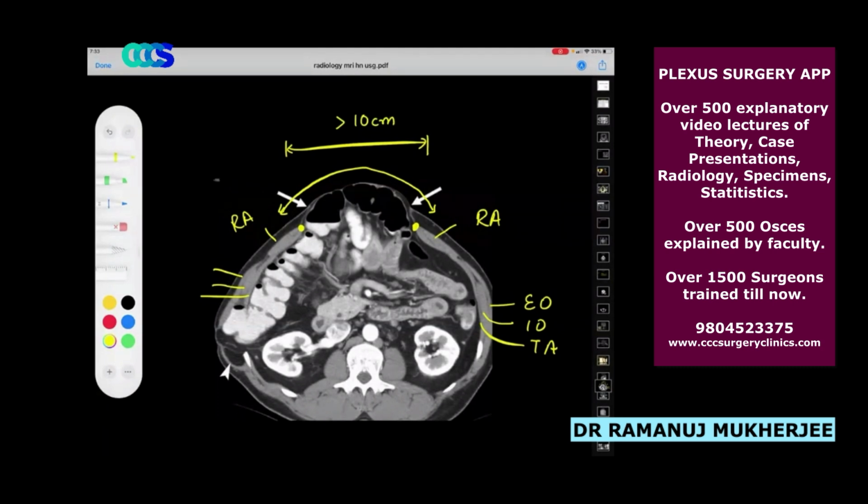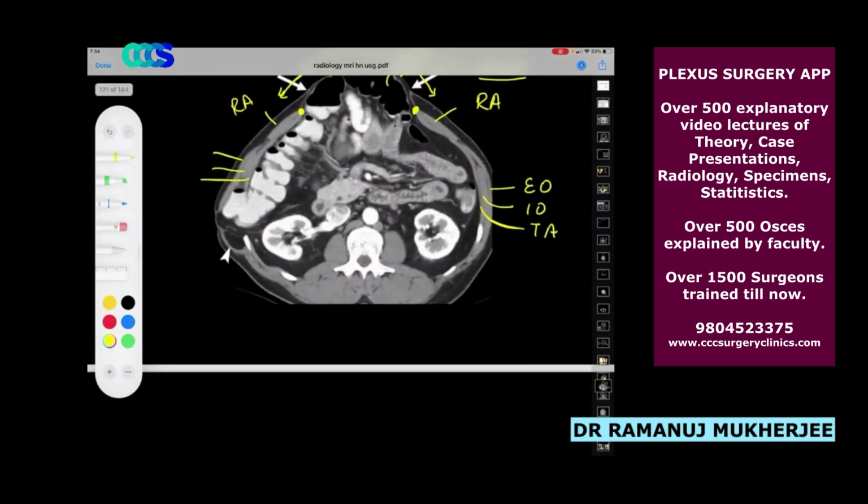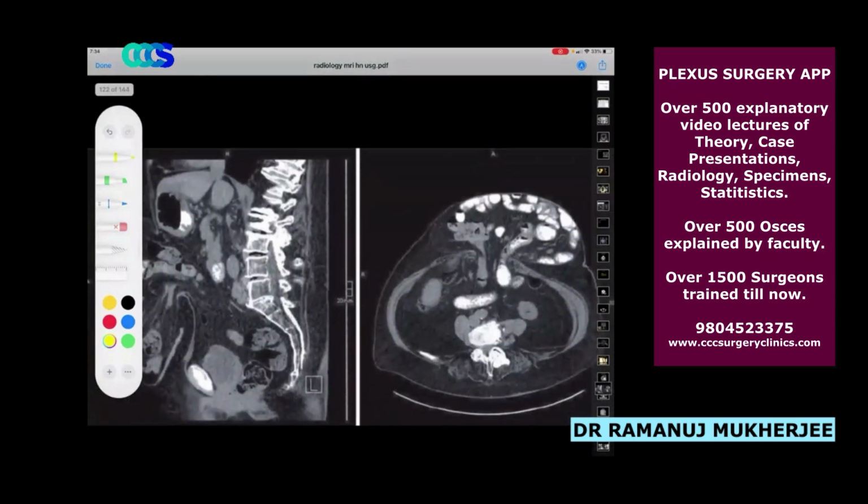Point number 2, the content in the hernia is gut, which, believe me, is very subcutaneous. That means probably the patient had a history of laparotomy, abdominal wound dehiscence, and the bowel is now stuck up with the parietes. Should make you very afraid when you are going in the abdominal cavity. Right. Now, in contrast to this picture, see this one.